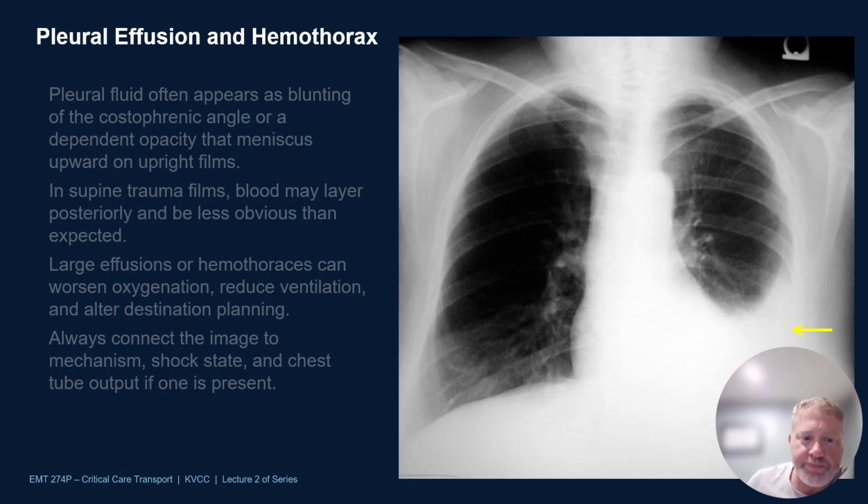Always take a look at the image and relate it to the patient and what you see. I mean, are they in some state of shock? Is a chest tube an option? And if not, what can you do to help release some of that fluid to allow that lung to better expand so they can oxygenate and ventilate.